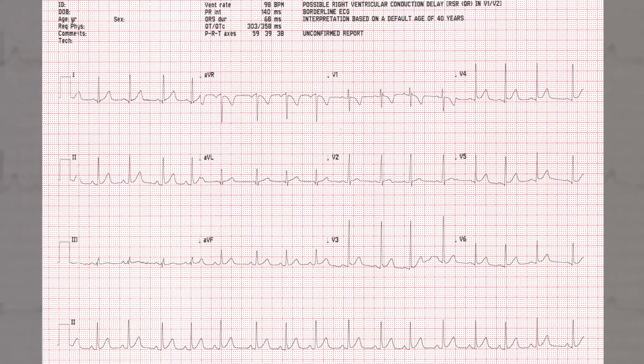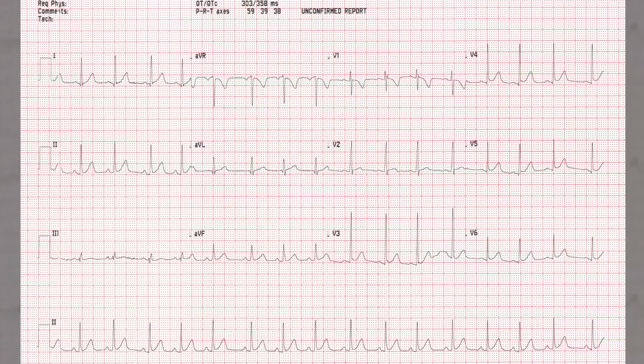The paediatric ECG is something that can baffle so many of us. Commonly, it leaves us feeling confused, uncertain, and also with a tendency to call for specialist input more than we need to. If you've got a simple plan that you can follow, you can go through it logically. So here's how to do it.